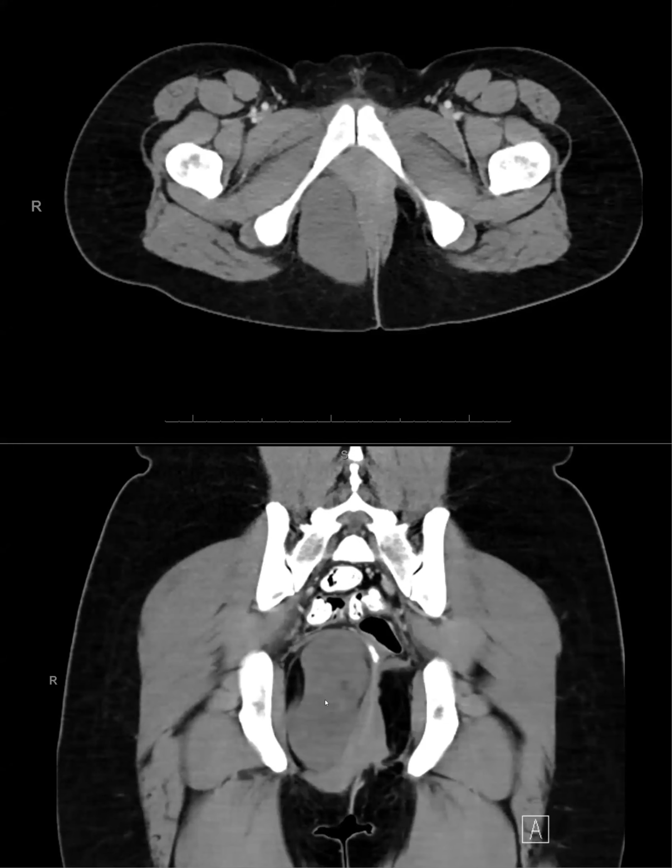Yeah, that's a good guess. What else? We've shown this case before here. Really? Yeah. But I don't expect you to remember all the cases. But usually we bring up aggressive angiomyxoma. Yes, so that's what we led with for our differential on this. We also considered cellular angiofibroma, myxoid mesenchymal neoplasm.